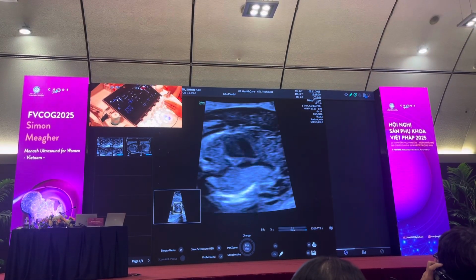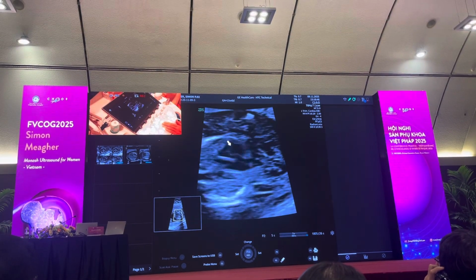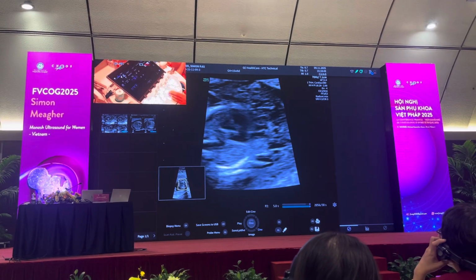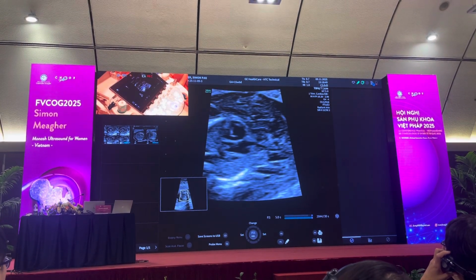So, as I'm looking at it, the next thing I want to look at is the descending aorta. This is the left atrium, left ventricle, right ventricle, right atrium. As I'm looking at this page, it's got a VSD. So if I look here, I see that this is edge enhancement and there's dropout. So I see there's a ventricular septal defect.